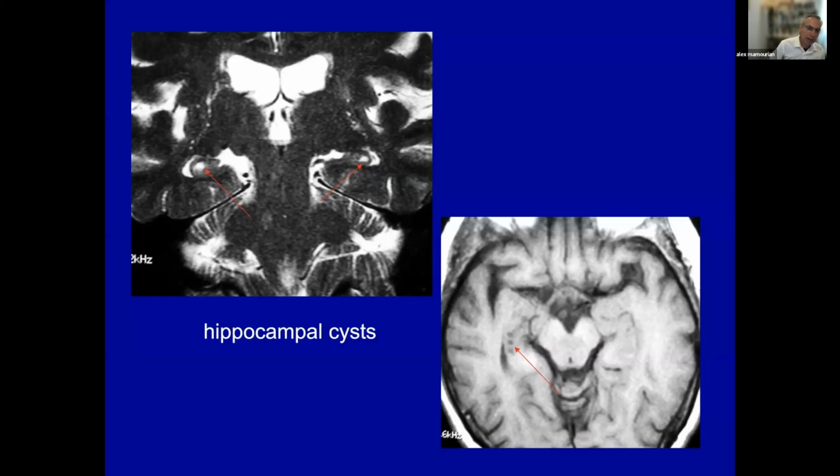Now, one thing I want to draw your attention to on this image, you might say, okay, what about this hippocampus? And I see a thinner fornix on this side than this side. Now, I didn't get into this in this talk as an introduction, but this is something that we published years ago, is that the fornix can be smaller on the side of the bigger ventricle.